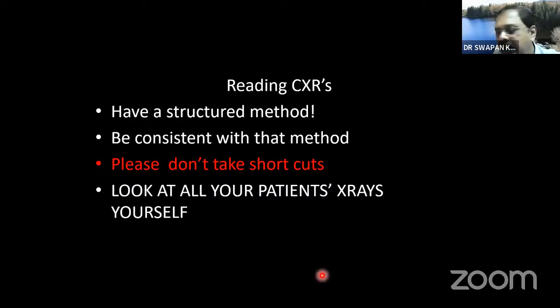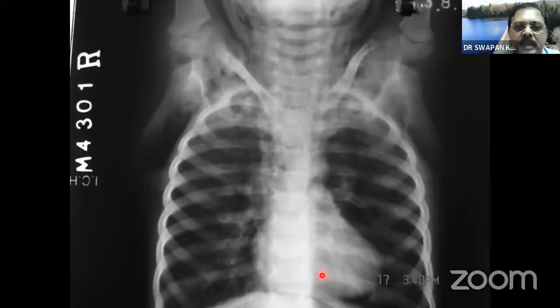So next, I will request all of you, when I show you the X-rays, to write in your chat box within 5 seconds. If it is not 5 seconds, a maximum of 10 seconds can be given, because it cannot be one-way teaching. You must interact with that. That's why I can know that you have imbibed what I was trying to impress upon you. So this is the first X-ray. You start giving answers. What can be these diseases?